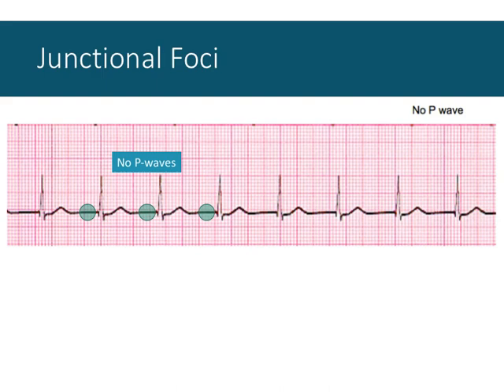We're relying only on ventricular firing to maintain heart rate in this case. Consistent junctional escape rhythm. So this could be continuous block of the SA node or damage to the SA node. So we're relying only on the AV node as being the pacemaker of the heart.